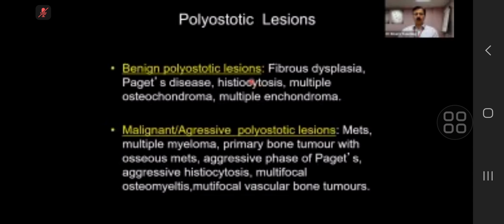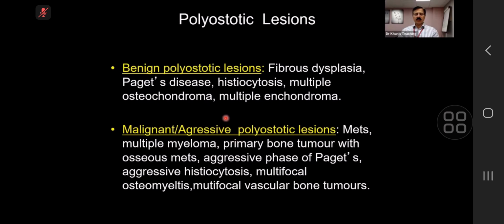This now goes to our Monday schedule. Multiple osteochondroma, multiple enchondromas, all of these things are important. And of course, other than metastasis, there can be aggressive polyostotic lesions, as on this slide here.